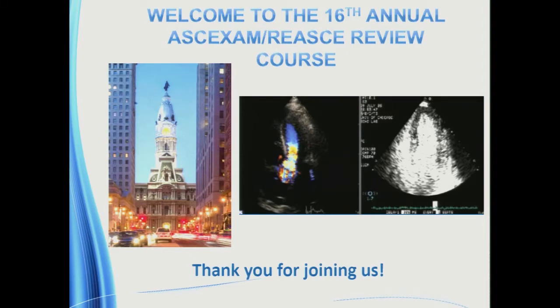If you observe well enough and go through a full sweep of the left atrial appendage, sludge you can generally tell because it's moving back and forth slowly. It looks slow, gelatinous, moving back and forth. The mass, I think you can tell if you have a good quality TEE that there's a mass there. I don't know, Marty, what your thoughts on that are.